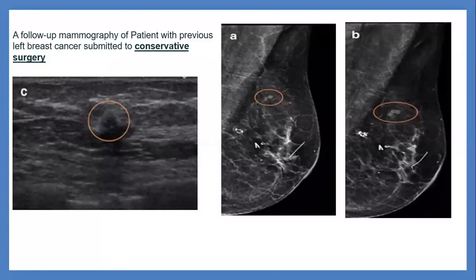The ultrasound shows a suspicious small mass with indistinct, non-circumscribed margin and faint posterior shadowing, with absent hilum and posterior acoustic shadowing. I can't see a hilum here. I will just describe it as a mass. It doesn't look like a lymph node. If this is a follow-up, it seems to be increasing in size.